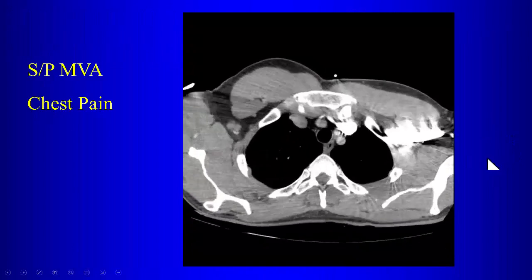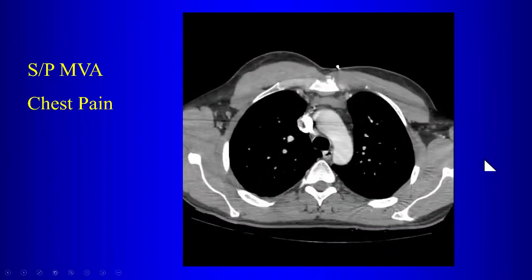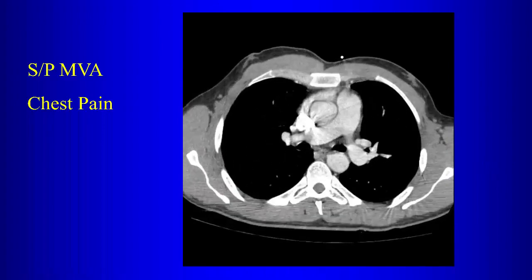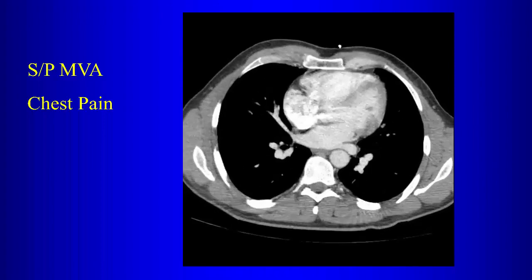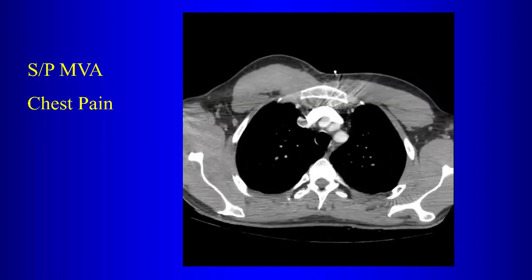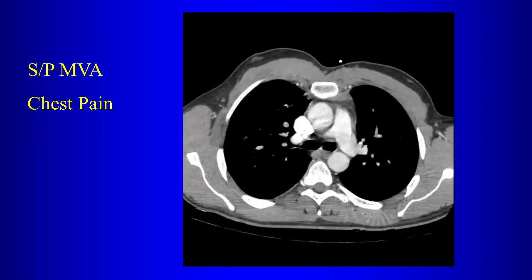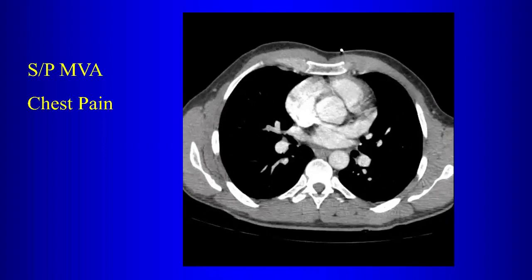Another patient here who's had trauma, chest pain. What can you tell me about this? Well, the first thing is, is there hematoma?